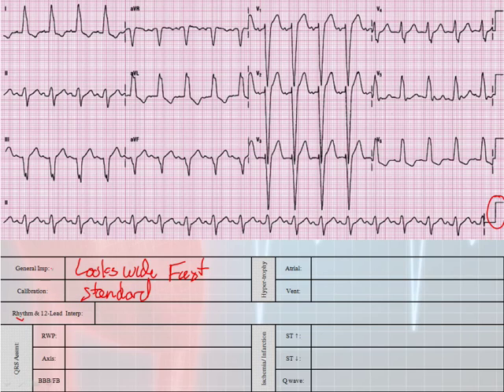My rhythm interpretation, if I follow my rhythm interpretation down here on lead 2, it looks like it's a wide QRS, first of all. My P waves are there, they're married to the QRS complexes, it looks like they're all regular, so I'm going to say a sinus rhythm at, what is our rate? Starting here, 300, 150, 100. So it's probably a little faster than 100, so we'll say a sinus tach at, we'll just say 105, since I'm kind of rushing through this.